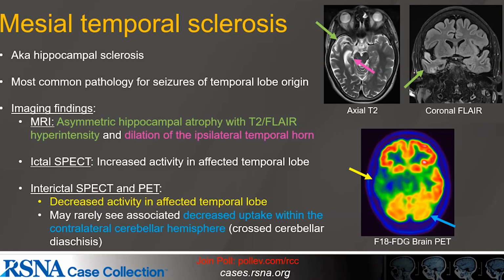Note that you may also see contralateral decreased activity in the cerebellar lobe, which we are marking with a blue arrow, and this is a reactive phenomenon related to crossed cerebellar diaschisis.